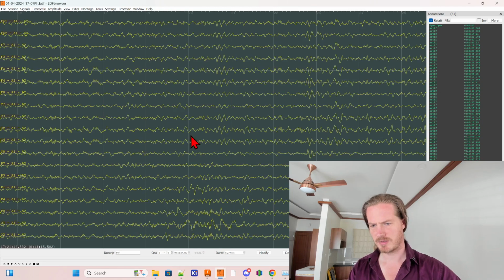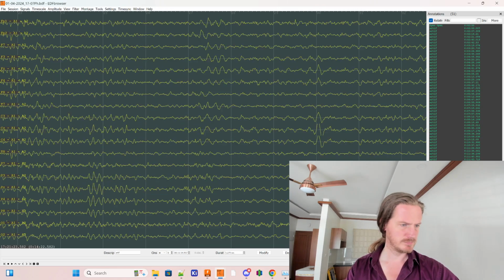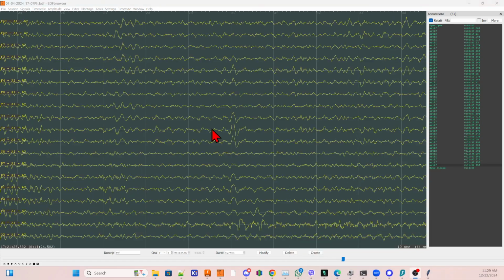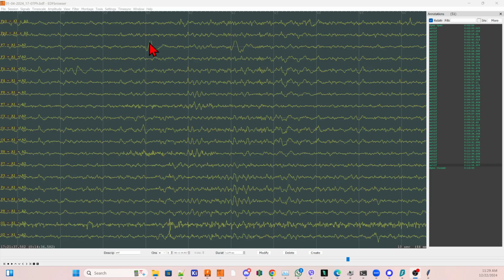I'm going to accept this, whatever this is here at the bottom. So here we have a little shift, and then again here. Because it's only in one channel, it is clearly not an eye blink, because that would happen in this whole area here. But I'm still going to mark it there. Artifact and artifact.